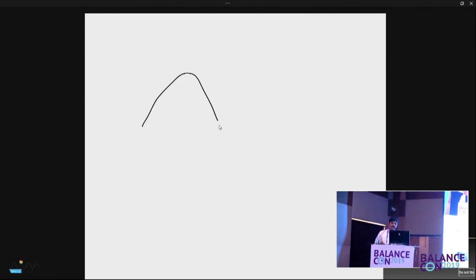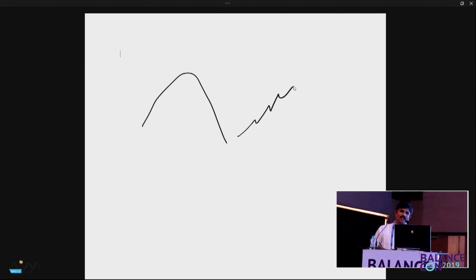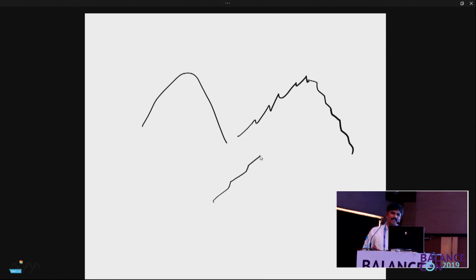In the nystagmus intrusions, there are two typical patterns you see in the smooth pursuit. One is that you see catch-back saccades in one direction and catch-up saccades in another direction. The other way it looks is that you only see catch-up saccades in one direction, and on the opposite side, it looks normal. These are two ways in which a nystagmus can interfere with smooth pursuit.